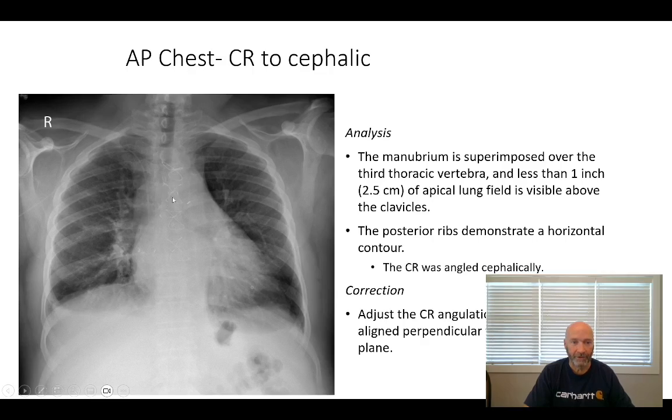But again, we've got a patient who's had open heart surgery. They've got a central line. What is it we're looking for specifically in this image? Are we looking for the central line placement and whether or not it's in a good spot? If the answer is yes, then this is probably a pretty good image. If the answer is no, or the doctor's not around, most of your techs would be hard pressed to repeat this image. But what you as a professional need to see is you need to recognize this and not make the same mistake on the next one.